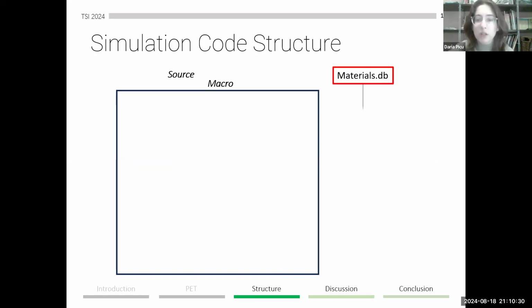First, we have to import all the materials from a separate materials database, which is GateMaterials.db. Then we add the commands to create a world, which is a cube with a length of 150 centimeters, and we set up the PET scanner volume, which is a 60 by 60 by 60 centimeter box made of air, where air was already predefined in our materials database. A visu.mac visualization file was added, which contained all the information about the scene and the viewpoint, which allowed us to easily view the scene when running GateQT.